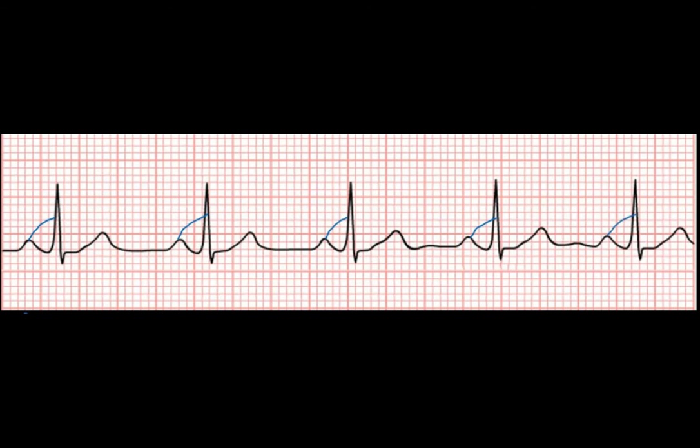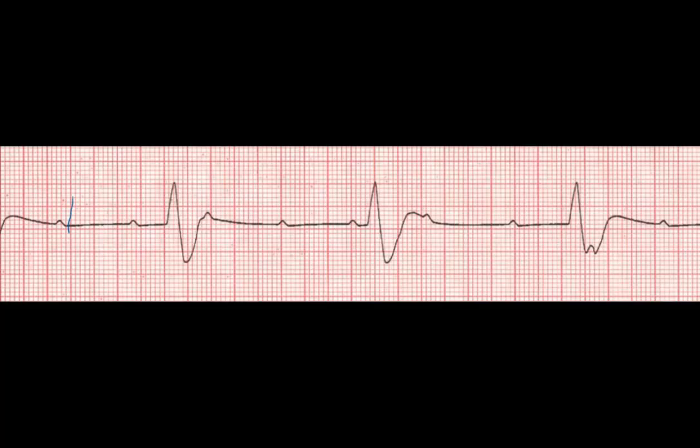Now, come down here, there's a P wave, we're missing a QRS. P wave, is this here a QRS complex? And the answer is yes. Is this connected to that? Well, the rules really state that if there is a delay, it has to be greater than 0.20 seconds of time. And we'll talk more about those later. It doesn't give it a maximum. So for this, we're going to say that these two are connected.